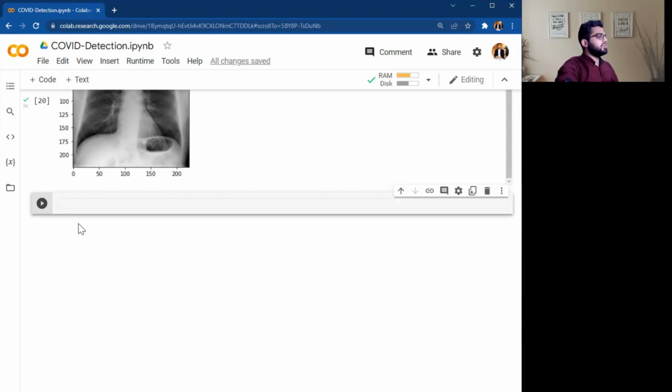Actually now we need to convert our prediction into a binary class. So convert the probability vector into a target vector. For example, if you have a vector like 0.5, 0.3, and just for example, and your model predicts this, we will take the maximum, this one. This is the maximum, 0.5 probability.